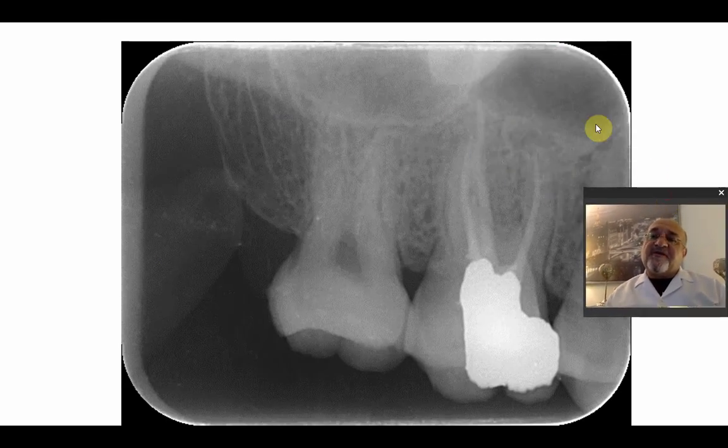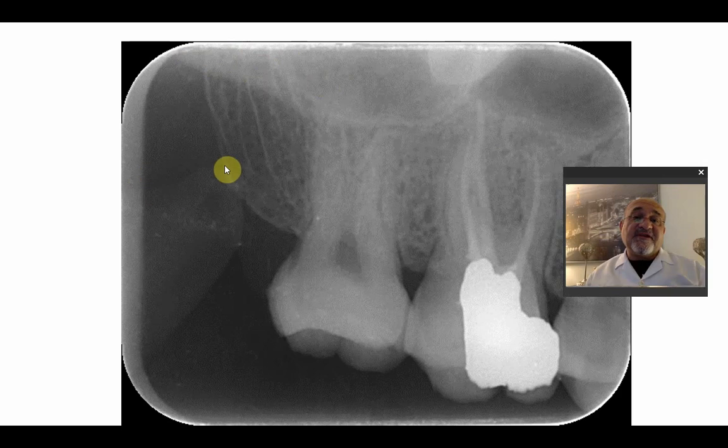Another radiograph here. Remember this? This is not the zygomatic arch. This is the zygomatic process of the maxilla, and posterior to it, all this shadow over here is the zygomatic arch, actually the inferior root of the zygomatic arch, and this is the coronoid process. See, it's smaller than the previous radiograph. Depends, of course, on anatomical variation.